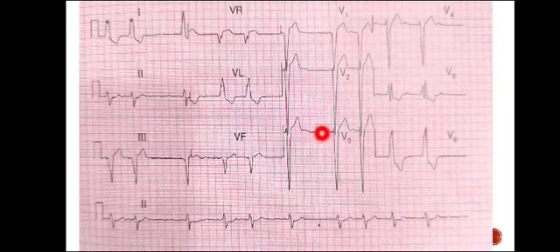Lead AVL में भी आपको T wave inversion मिल रही है, और V5 में भी मिल रही है, V6 में भी मिल रही है. ठीक है, तो this is following a vascular pattern. सारा आपका lateral wall इसके अंदर involved है. उसके अलावा बाकी QRS कॉम्प्लेक्सेस देखें. यहाँ पर लीड 3 के अंदर आपको थोड़ी सी ST सेगमेंट एलिवेशन मिल रही है, लेकिन lead 2 के अंदर नहीं है, सिर्फ 3 में है, AVF में नहीं है. तो ये एक vascular पैटर्न फॉलो नहीं करे तो इसकी इतनी importance नहीं है.